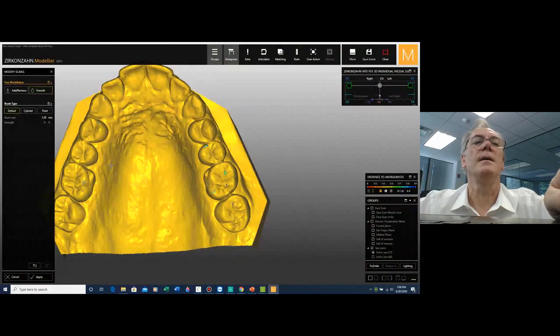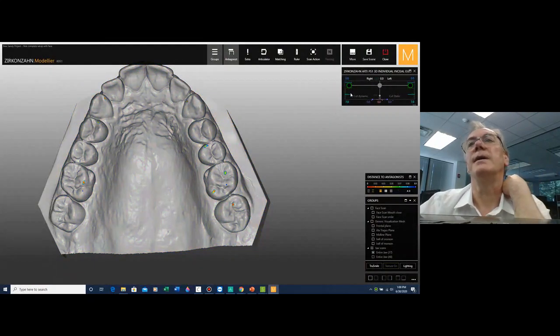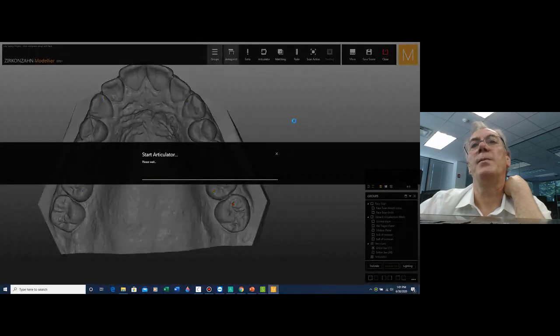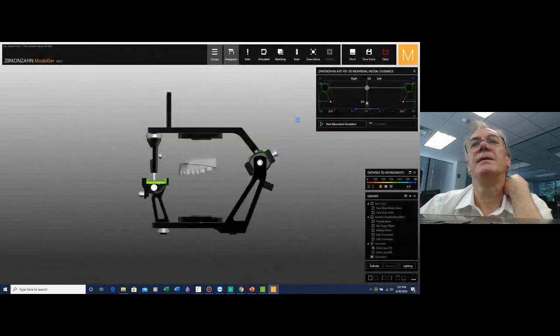Take it in, apply, and regenerate. I hope that this time everything comes through, and we can move to the option where we are going to try and add material and see the result.